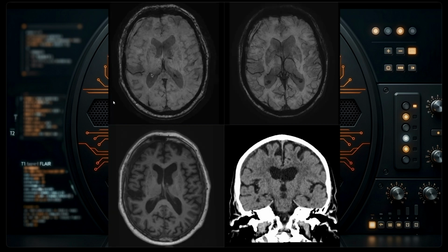Here we look at the signal characteristics of the subdural hematoma on the susceptibility weighted images, those two top images, SWI, that are sequences very susceptible to the iron artifacts that show iron deposits in the peripheral parts of the subdural hematoma called hemosiderin. You can also see the vessels, that's normal. Now this one is a thin slice, and this is the same in the MIP, a thicker slice, so it shows even more of this hemosiderin deposits.